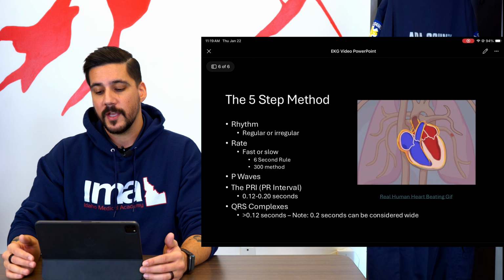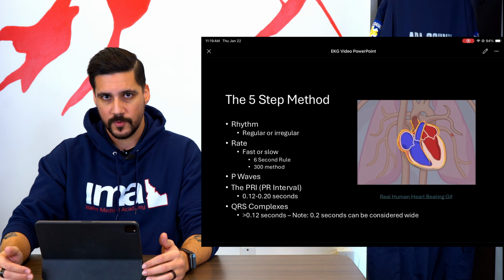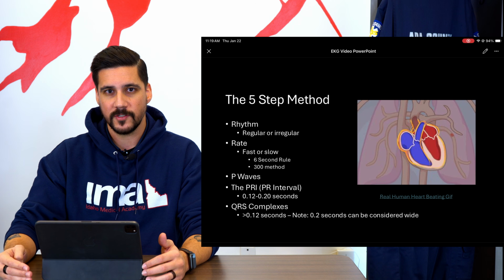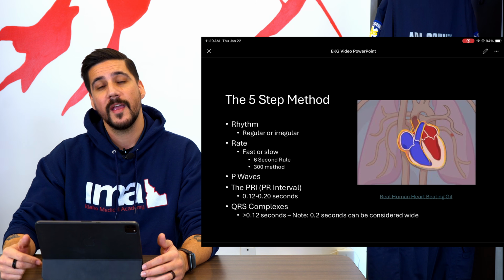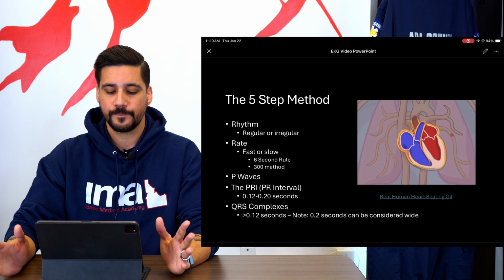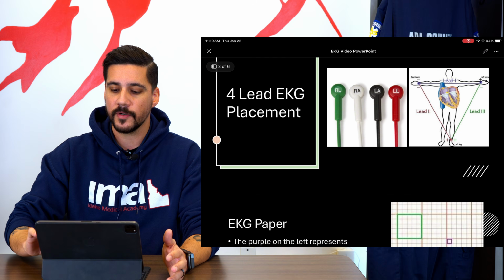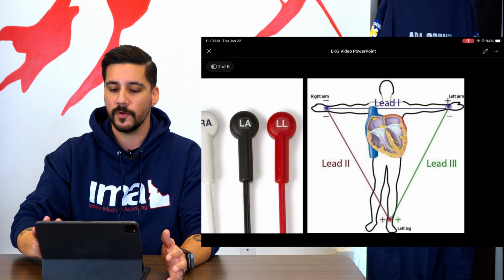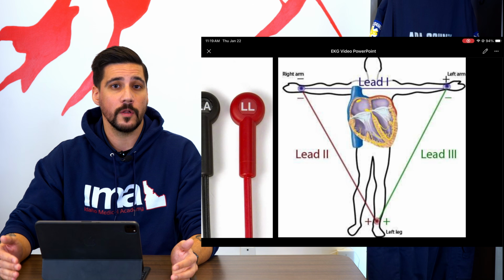Now with the 4-lead EKG, I should have talked about this a little sooner. When you get these strips with that on there, there will be 4 boxes that will be filled. Lead 1, lead 2, lead 3, and AVR, okay? Now, because of this, the numbers there, kind of scrolling back to Einthoven's triangle here, we tend to use lead 2 to read all of our rhythms.